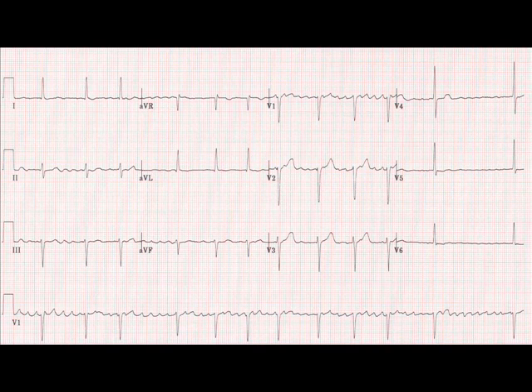And remember, if they're in sinus rhythm in one lead, they'll be in sinus rhythm across the rest of the recording. To answer that, we look at the rhythm strip printed along the bottom of the ECG or EKG, because it will give you the maximum number of complexes and therefore a great deal of data to work with. You'll notice here that the rhythm strip is V1, and that's quite unusual. It's normally lead 2. That's because lead 2 is a very positive or upright lead, and therefore arrhythmias appear more familiar. So I'm going to look at the rhythm strip, but also at lead 2.